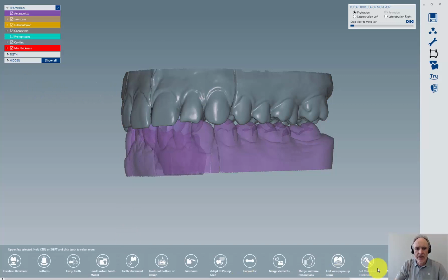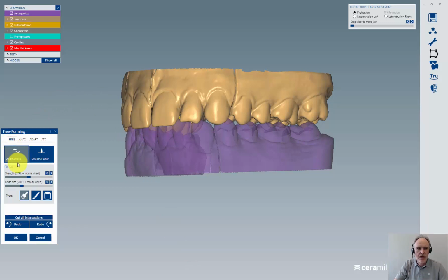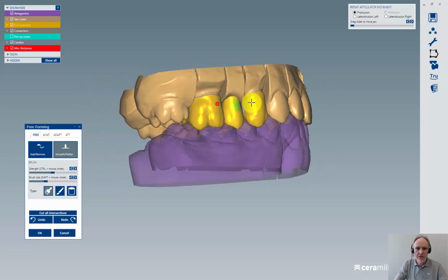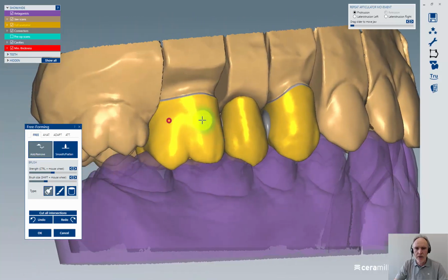Especially for freeforming, that's interesting. For example, here, if you are freeforming something and you are switching between free, add, remove, and smooth, I type the number 1, I type the number 2. Even if I'm on the model with the freeforming process, I can change between freeforming, adding with number 1 and number 2. That's a really nice and quick thing for working in the design.